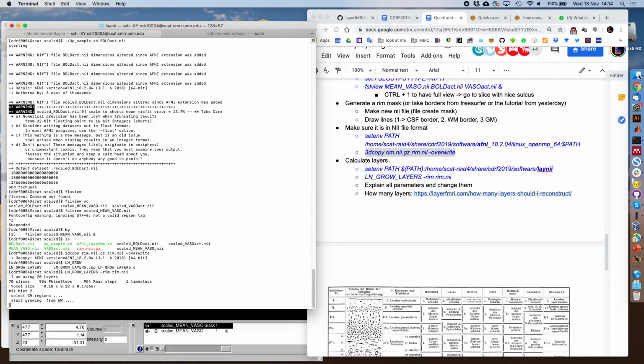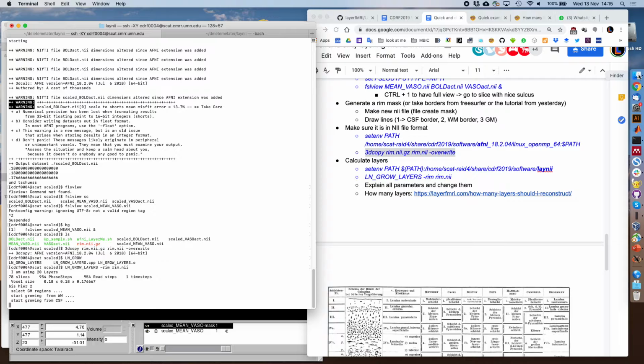So now the data file, even though it's a single TR image, is in the range of maybe 250 megabytes already for 16-bit integer. No, oh wow, this is 64-bit, that's why it's huge. Not sure why it did that.